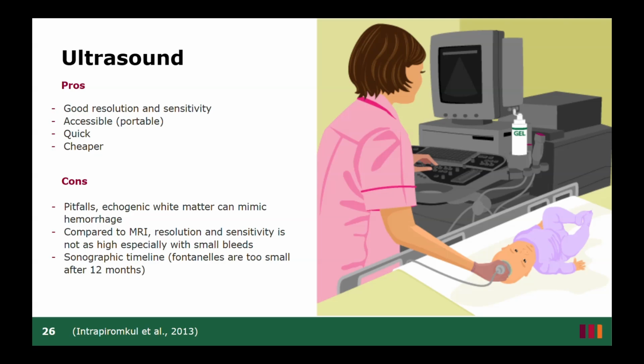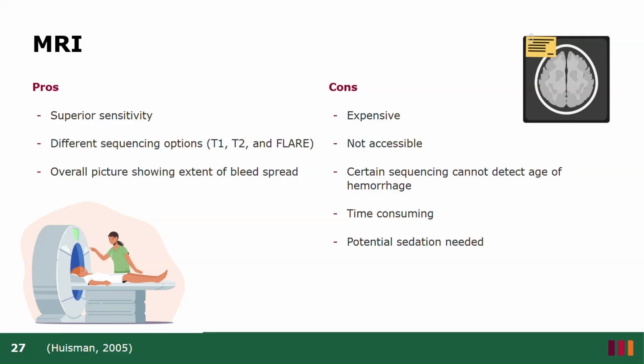Lastly, as the baby grows, the fontanelles will close and our scan windows will become progressively smaller. After 12 months, ultrasound can no longer access our scanning windows. MRI has high contrast resolution, superior to the level of ultrasound.